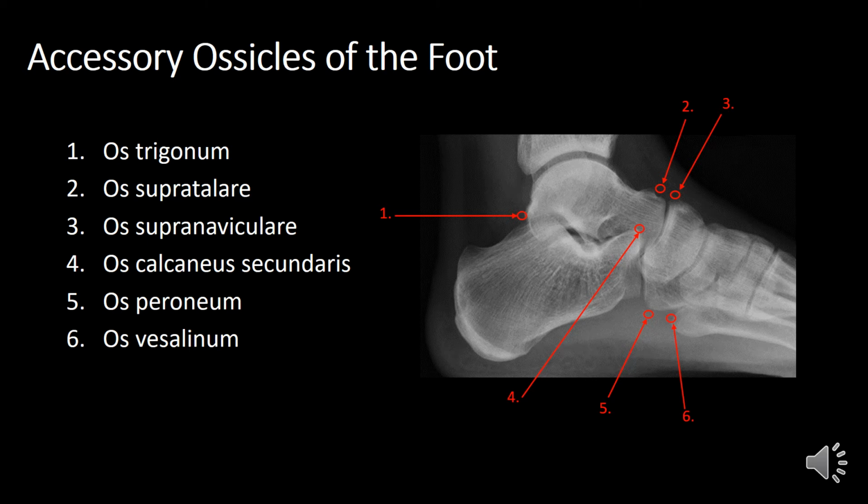Here we see potential locations of accessory ossicles of the foot from the lateral projection. Don't forget, some of these will also be visible on the oblique too.